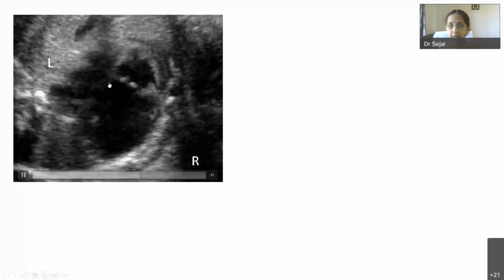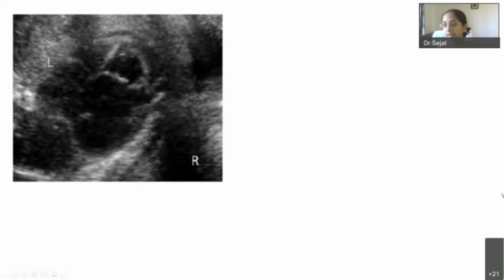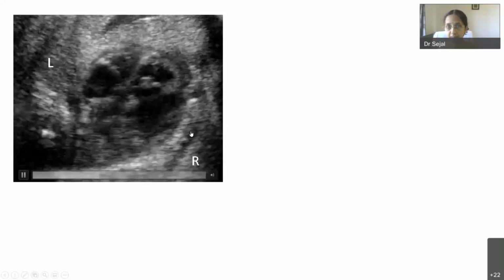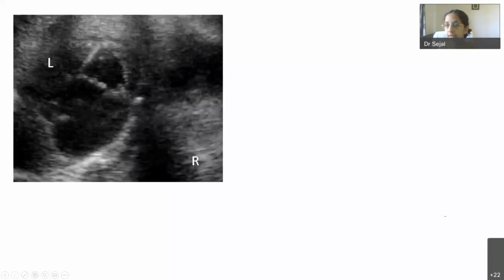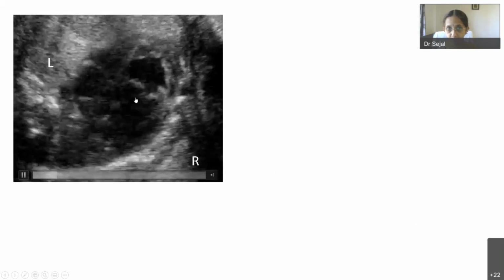So when I have RA so big, somebody is saying dextroposition. Okay, I will just tell you here, 1 minute. The dextroposition, I'm not going to comment on this because, in fetal life, I may not be showing you an exact well-centralized heart. I'm just trying to focus on a particular part of the heart better. So dextroposition may not be a stand to be taken. Dysplastic tricuspid valve and dilated RA, I fully agree. So in this situation, you will focus a lot on the tricuspid valve.